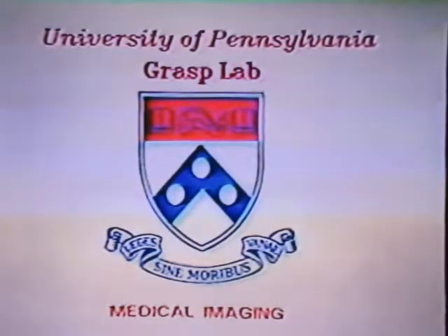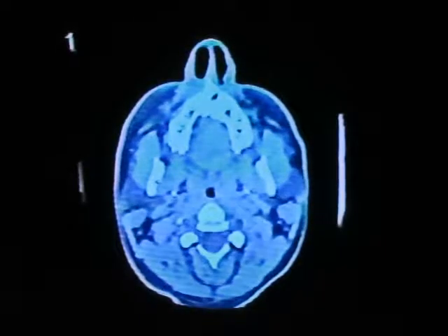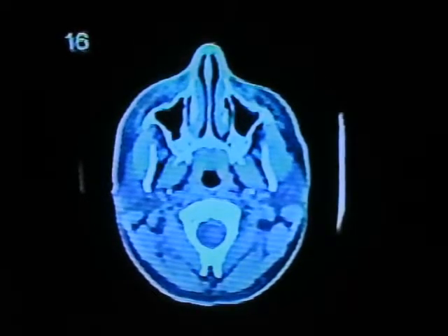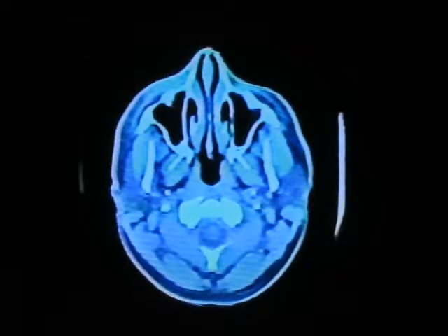We're investigating various methods for the rapid display and manipulation of three-dimensional medical images. This is a series of two-dimensional slices which have been obtained through a standard computed tomography examination. These slices may be stacked to form a three-dimensional object. These three-dimensional objects may be displayed and manipulated using a variety of tools which we have developed.